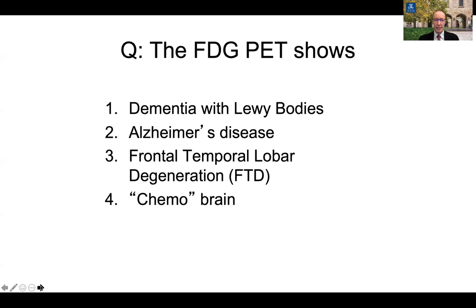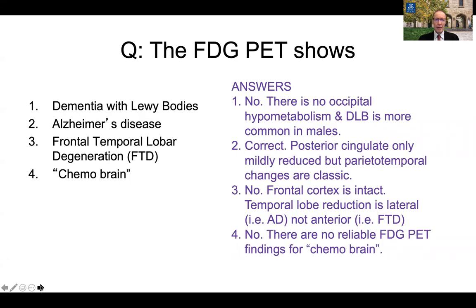So you should have an answer. Dementia with Lewy bodies? No, there is no occipital hypometabolism. And dementia with Lewy bodies is more common in males. So that is another clinical factor against it being the diagnosis in this patient.